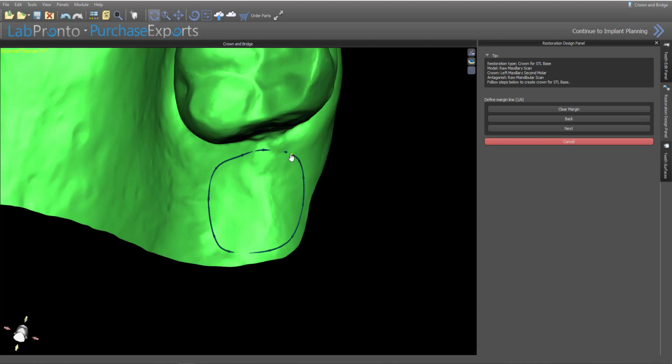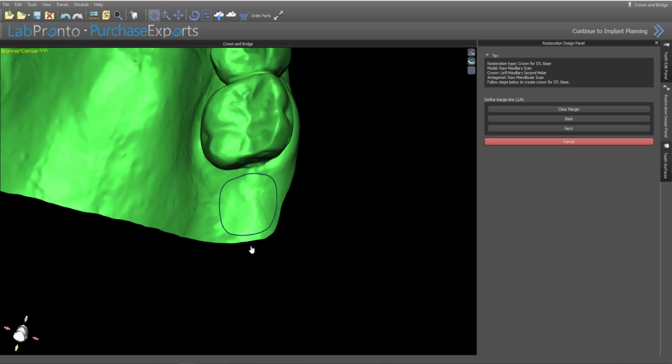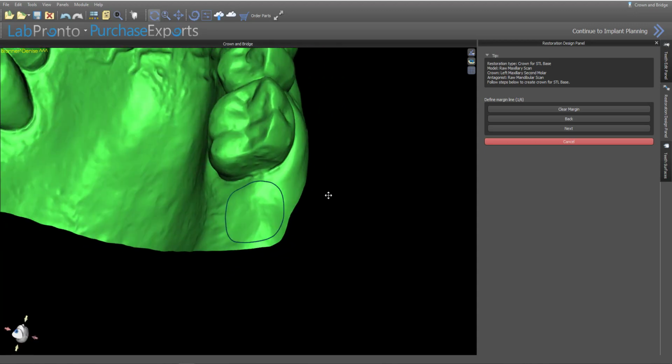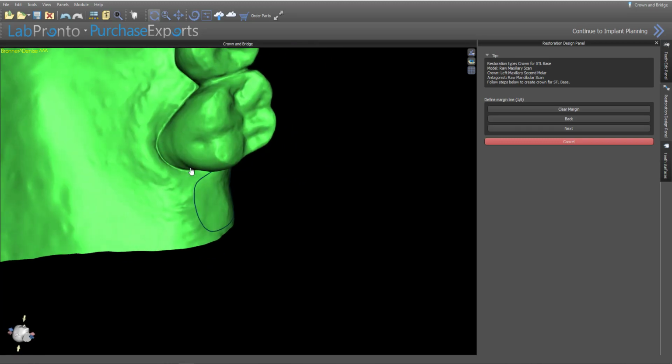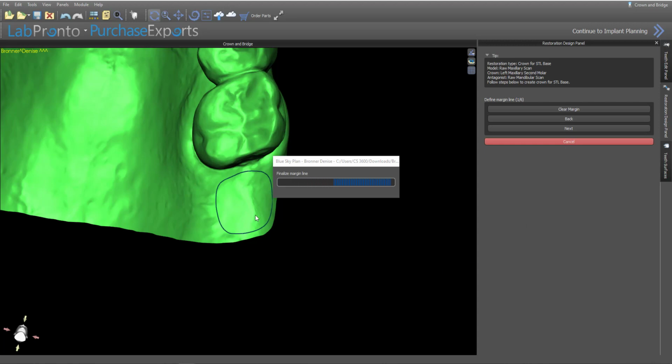Okay, remember it is a smaller tooth, and so we don't need to go with a huge one, like you would have on this first molar, that's also got this recession. So remember, we're doing a narrower tooth, so I'm going to just do that.